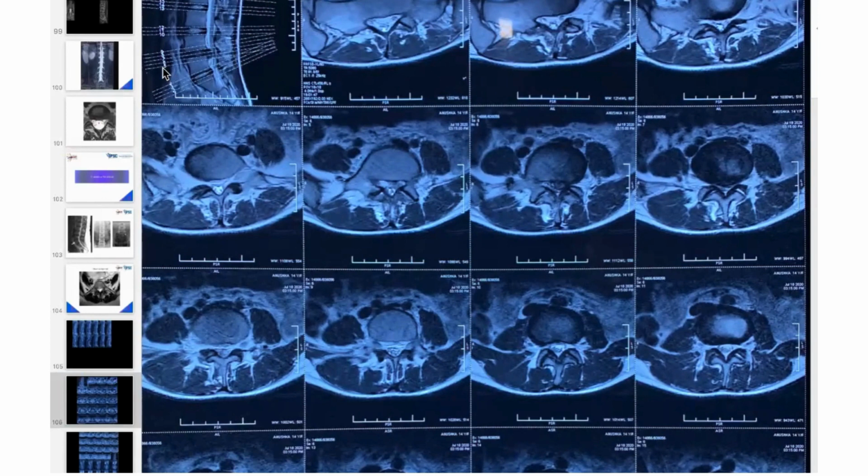The 6 number is taken from the end plates. And now you can see there's a herniation over here, because this section is taken from the end plate. This is slightly migrated downwards. And now the 6 and 7 numbers are taken from the center of the disc.